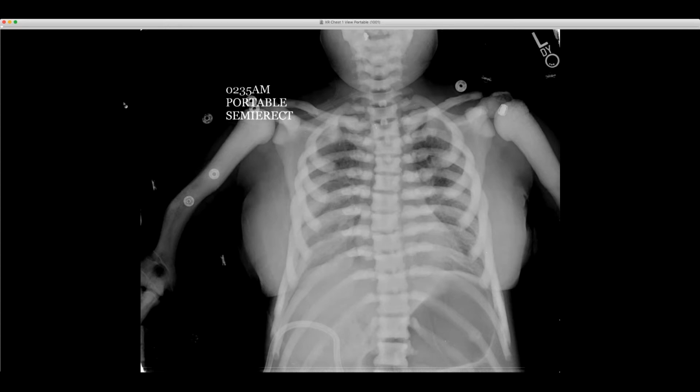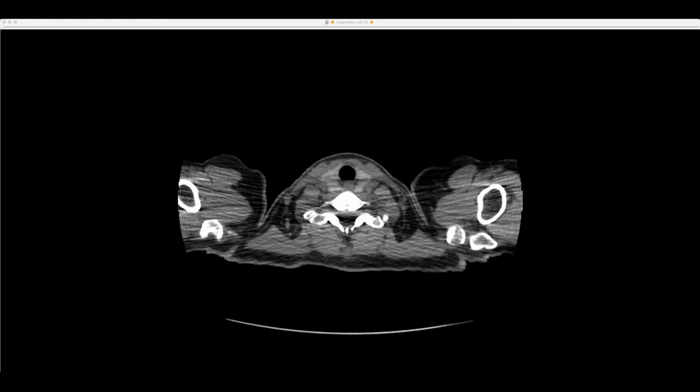And how old are they? Because it looks like a pediatric radiograph. Well, they're an adolescent, so they're not a really young patient, but in the teens, I believe. I can't remember the exact age, but sorry, 23. Okay. Wow. I guess she does have breast tissue. She should be fully grown. But it does have this kind of narrow appearance of the thorax. So anyway, that was just a quick one. This one is one I really like.